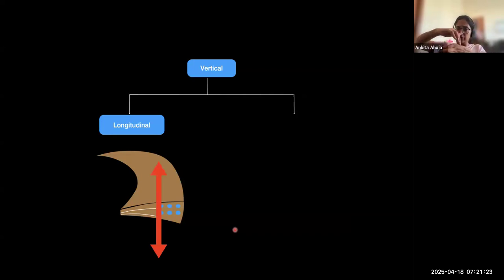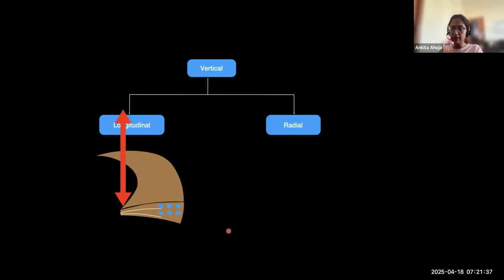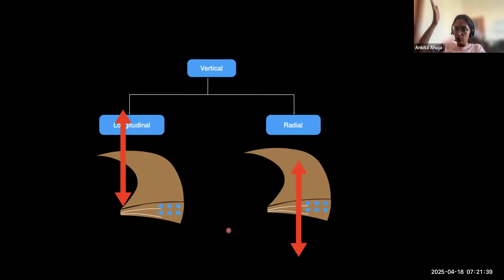You remember these were the circumferential fibers. So if my vertical cut is going along the meniscus like this, along the fibers, then this is a longitudinal tear. But if the cut is again vertical only, but going from inside to outside, then it is a radial tear. This is a very simple difference. If you know the fibers, you know the cut, and it becomes very simple.